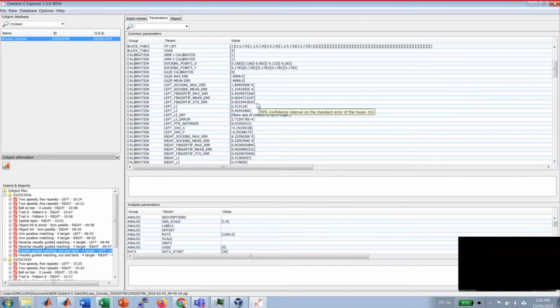So when you load an exam in MATLAB, you'll be able to see all of this, and Ian will be going over how to load an exam in MATLAB tomorrow. One thing I will point out that can be really super useful when you're doing that is if you right-click on an exam and say copy location to clipboard, then that is going to put the location of that exam file onto the clipboard, which you can then use to help make loading your exam in MATLAB much easier.